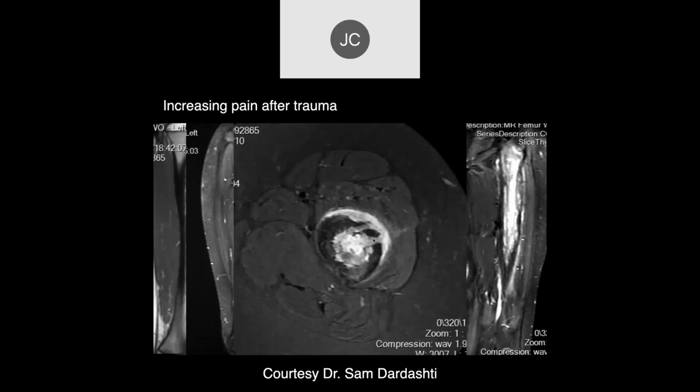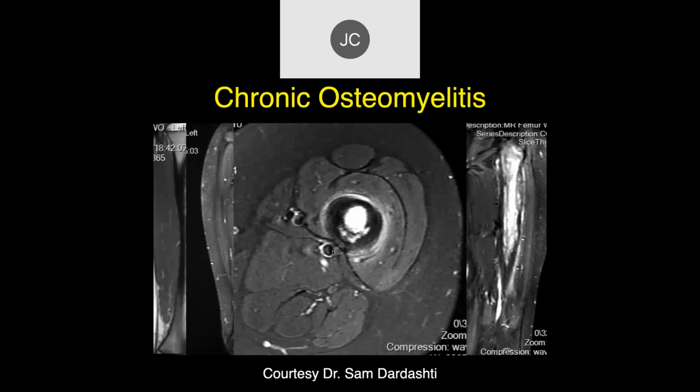And what are we seeing here? Looks like we have some break of the cortex there and fluid surrounding it. So we worry about pus coming in here. And maybe a little bone there. Makes it easier for a surgeon to drain it. Increased symptoms because of the increased activity of the infection. Okay. Very difficult to treat.